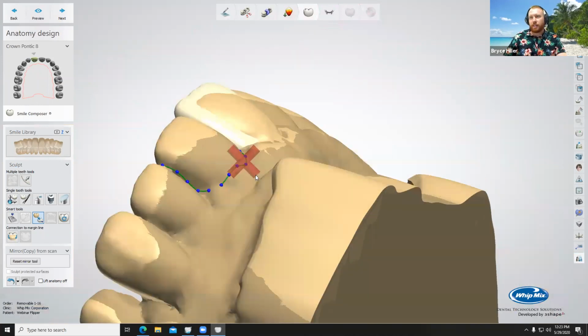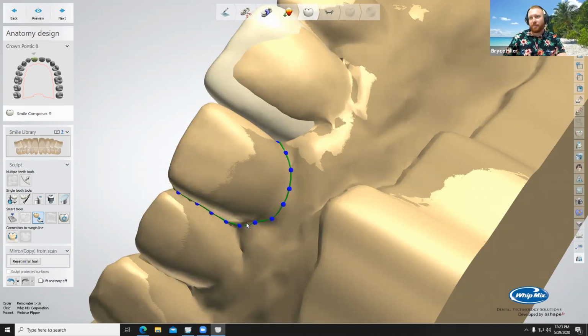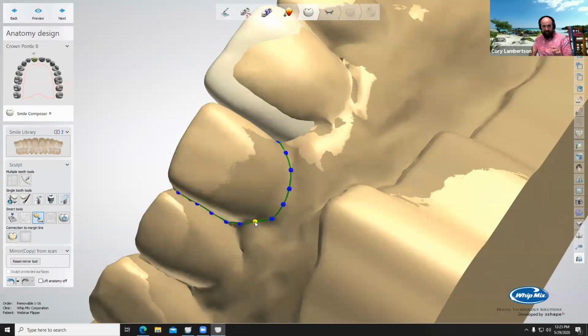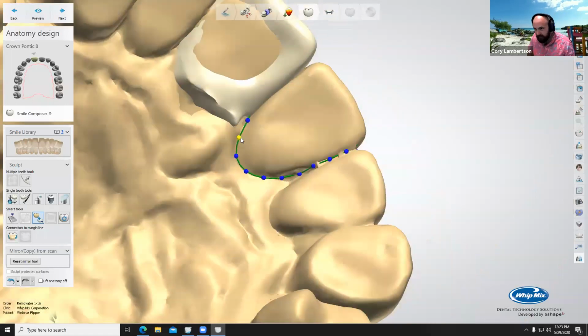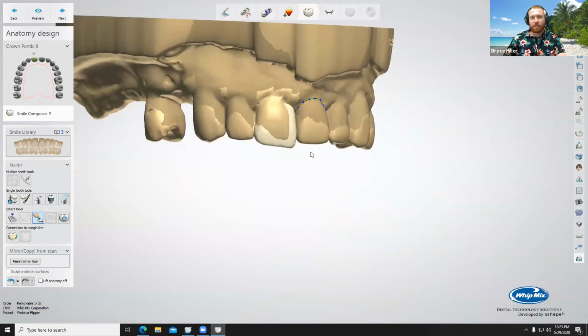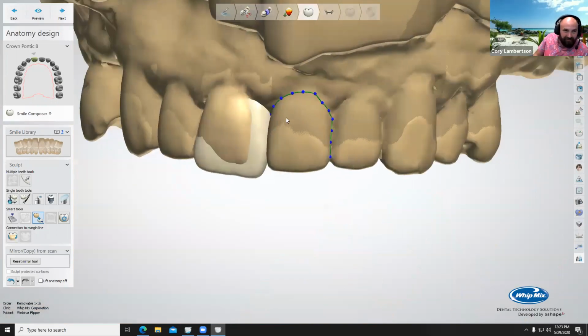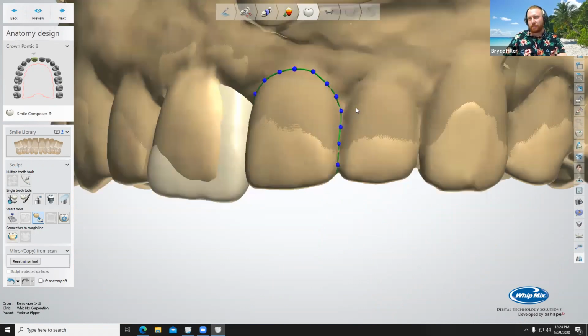There you go. And then hide that away. You're a pretty smart cookie. Every once in a while, I have a good idea. This is one of those every once in a whiles. Just don't let it get out that I just said that. My reputation will be shot. Don't ever tell anybody. No, that was a really good idea, dude. I didn't even think about that.